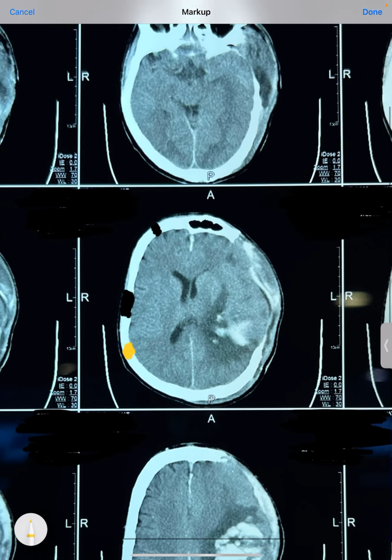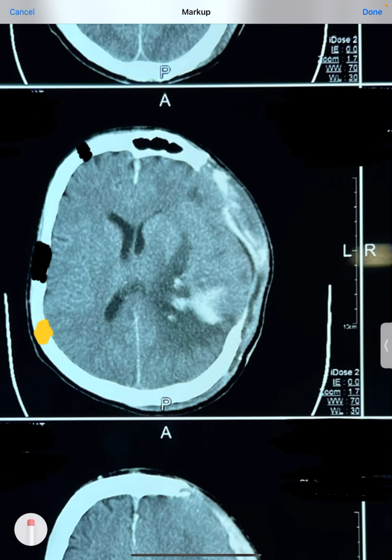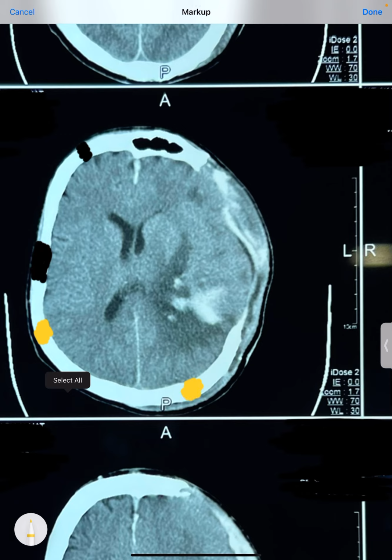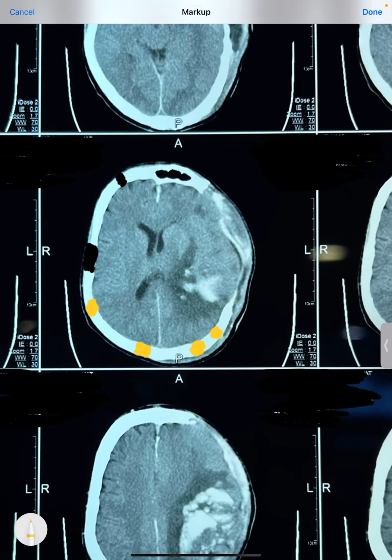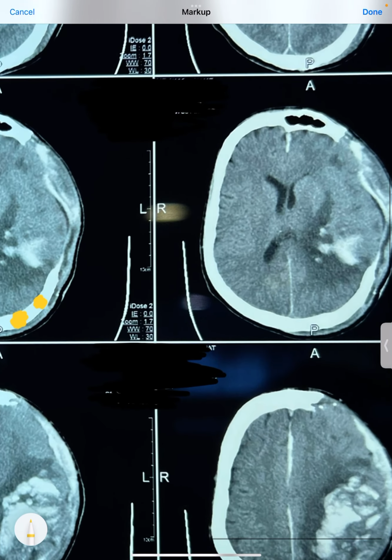This is a CT scan. Now, what we can see on the CT scan brain, the dense white structure, we call it radio dense. Radio dense means bright white structure is almost always bone or blood or calcification. So only three things usually appear dense white on CT scan. The first is bone, so this is clear cut bone, this is skull. The second is blood, and the third one is calcification. Calcification we can very clearly see most of the time in ventricles.